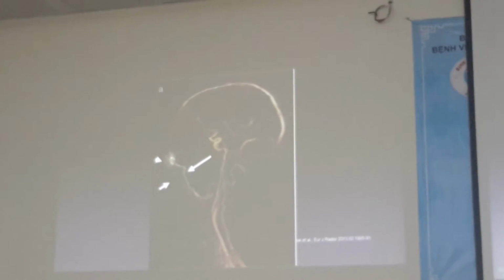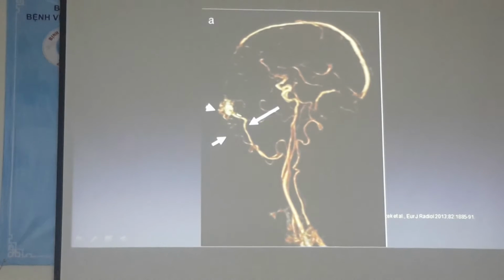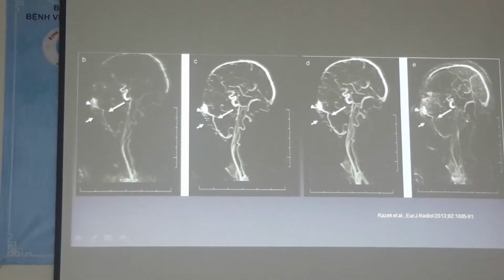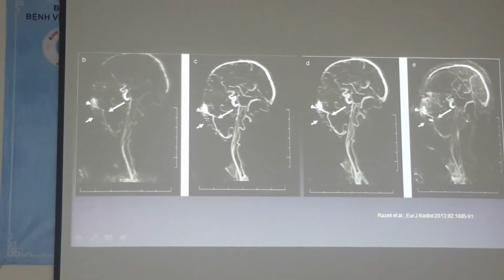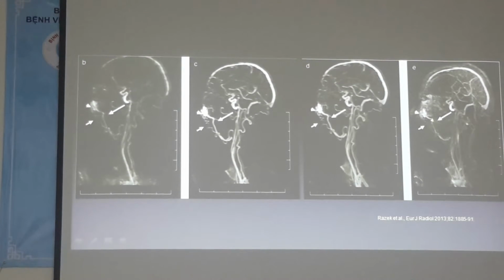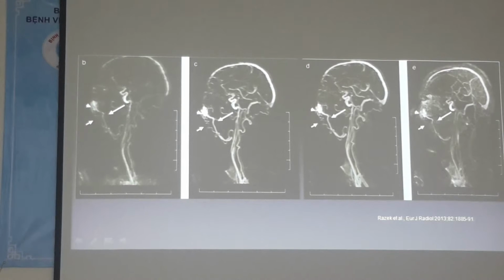So this is an example of a venous malformation or arteriovenous malformation where you can see the feeding vessel on the artery and then the draining veins coming out here. And then on this next sequence, this is a series of images with TRICS imaging that shows how over time there is more of a blush and more of a filling of this vascular malformation, with different demonstration of the filling and draining aspects of this lesion over time.